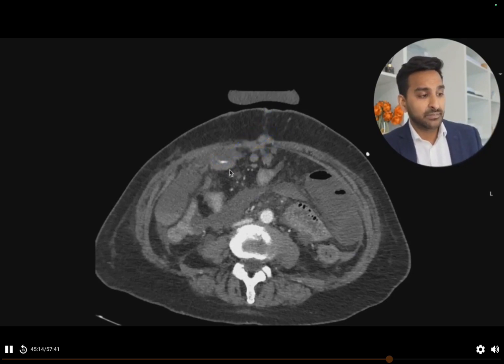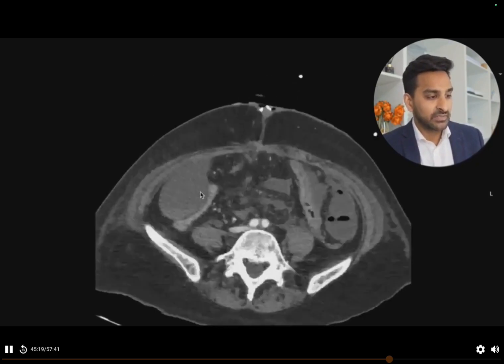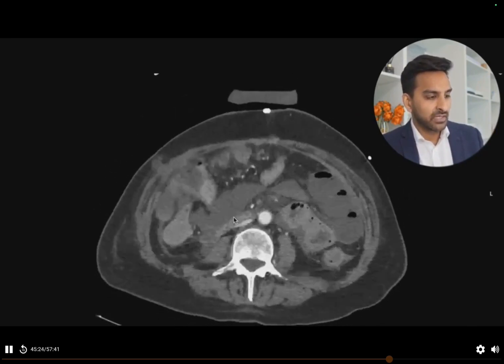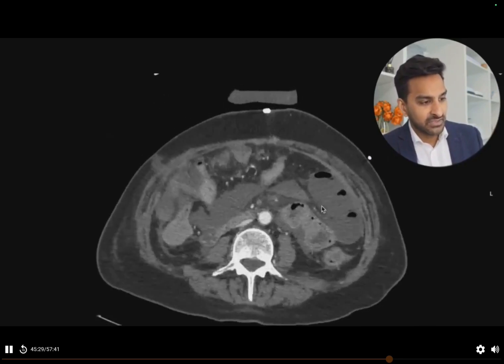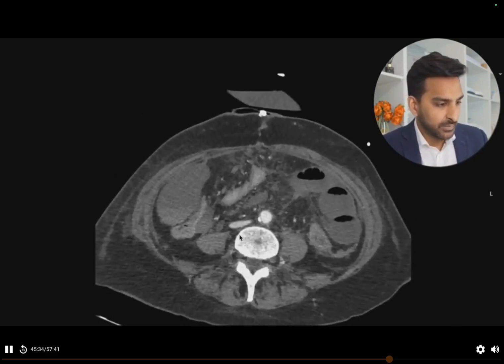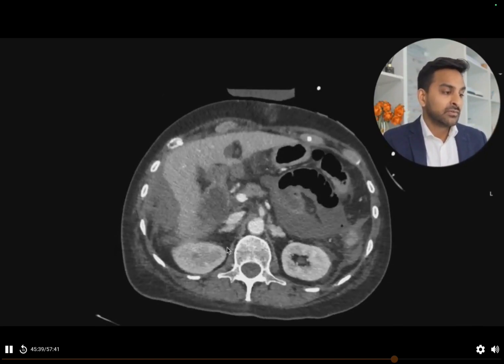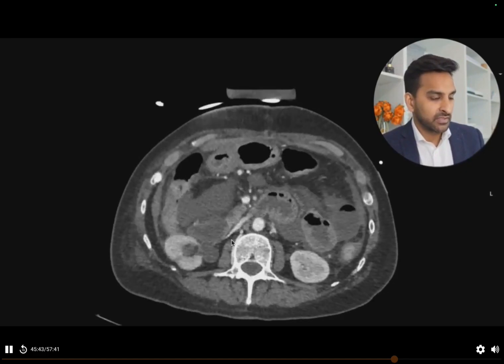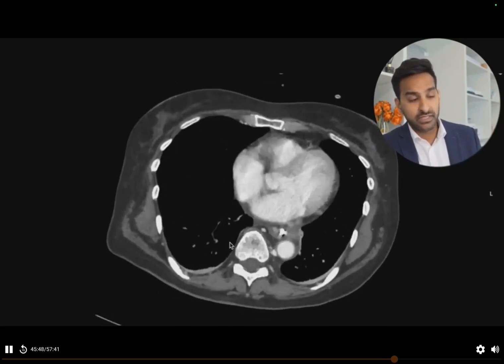This person is clearly bleeding from an active bleeding point located within the right mid-abdomen, and there's an extensive hematoma that is going through into the imaged pelvis and into the right upper abdomen as well, causing some scalloping of the adjacent liver. There's also secondary bowel ischemia, and there's also flattening of the IVC secondary to hypovolemia. The mass effect from the pelvic hematoma is causing a right-sided renal tract obstruction and subsequent dusky enhancement of the right kidney. And on top of that, you've got a misplaced NG tube, which would benefit from being resited or advanced further.